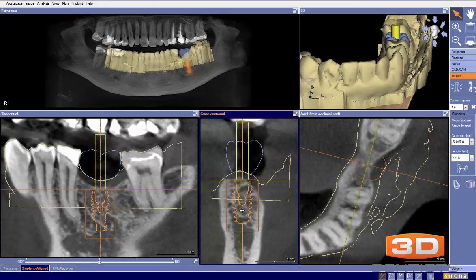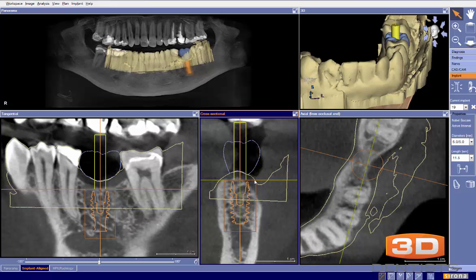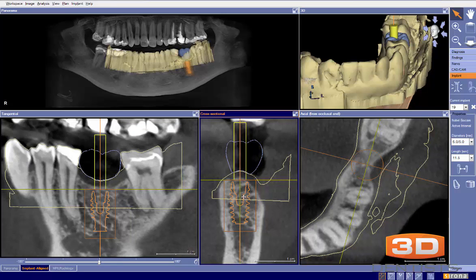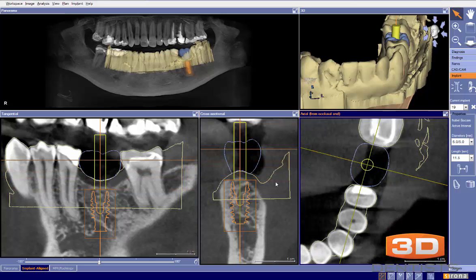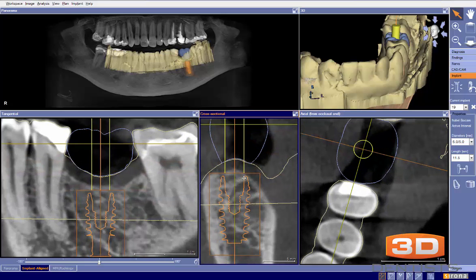Would be probably a little bit more ideal implant position, but that would require some grafting to be done here, and many of us aren't comfortable with that, so that's totally okay. So in this particular case, our next step would be to look at bone level. I think bone level going slightly subcrestal right here is totally fine. What we may have to do when we place the implant is use a bone profiler and just slightly adjust the bone right here so that we get a good bone emergence, so that we can get our parts and pieces and abutments seated to properly control that.